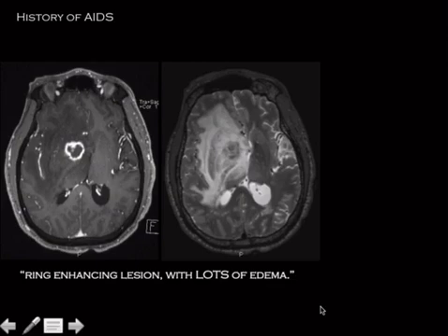Acute demyelination can restrict diffusion, but we know that demyelinating lesions tend to have an open C or like a horseshoe looking thing, and if they show it to you on multiple choice, an acute demyelinating lesion is not going to look like that, right? It's going to be C-shaped, an open ring shaped.